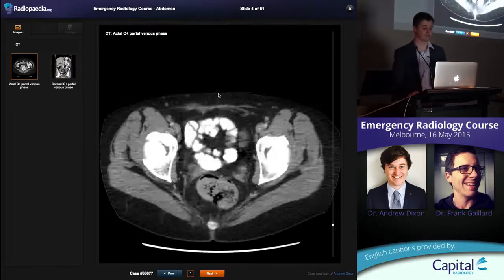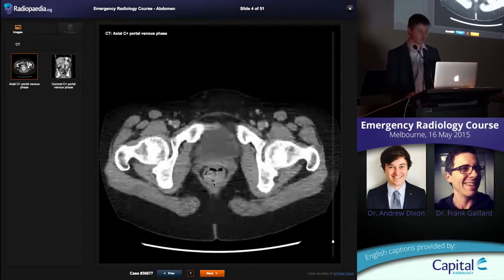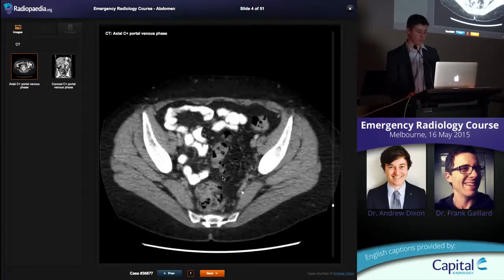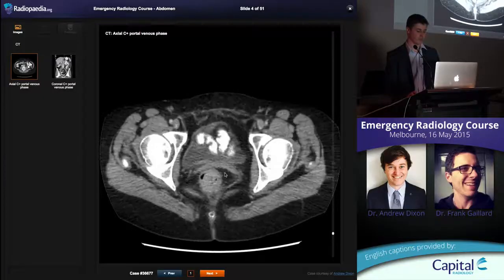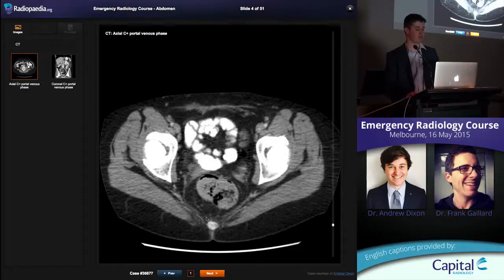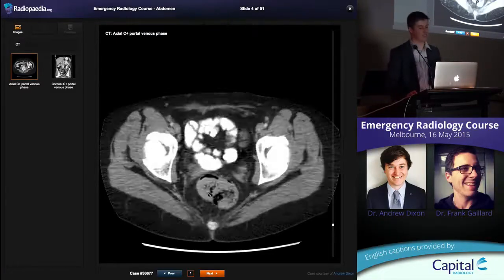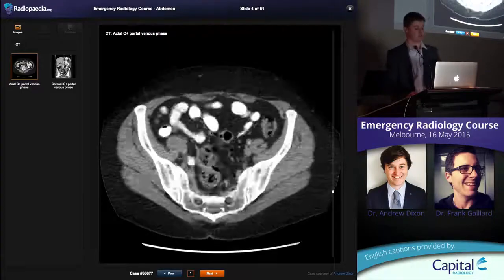Free fluid is something you need to know how to look for. This patient, I think it's a woman, but she's had a hysterectomy, but you're looking for fluid sitting anterior to the rectum or the vaginal stump here and between the bladder. Okay, so fluid sitting in this space here. If you've got fluid sitting out here in front of the sacrum, presacral space, that's extraperitoneal. That's pelvic fractures, something in the retroperitoneum tracking down. That's not free intraperitoneal fluid.